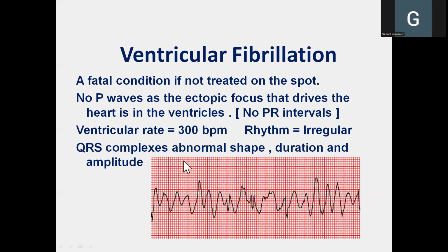1, 2, 3, 4, 5, 6, 7, 8, 9, 10, 11, 12, 13, 14, 15, 16, 17, 18, 20, 21, 22, 23. They are neither 15 nor 30. So actually, let's calculate it accurately. Let's say that we have 23 big squares.